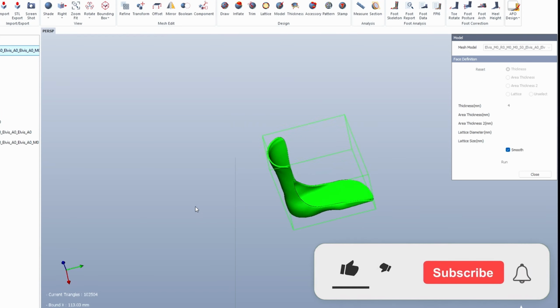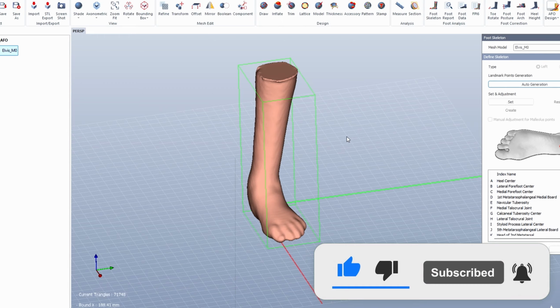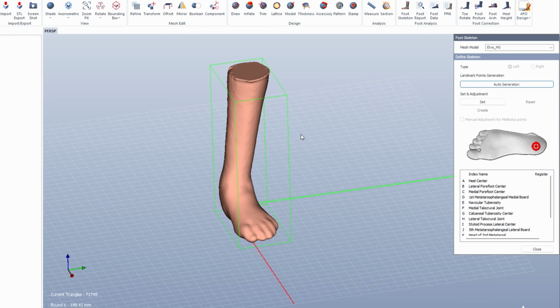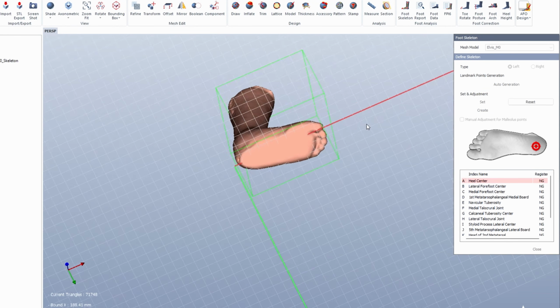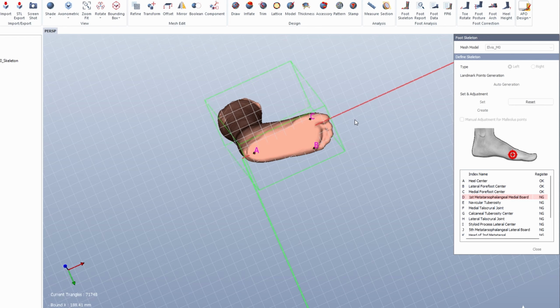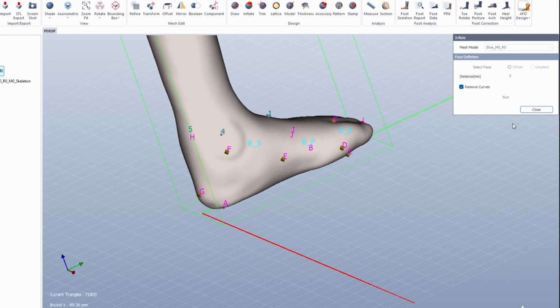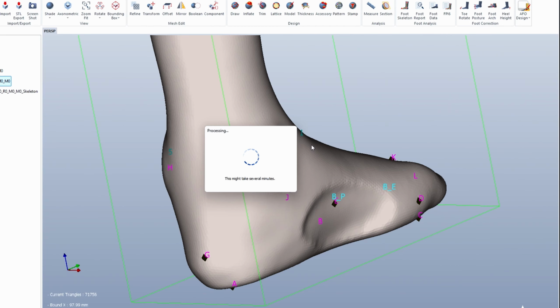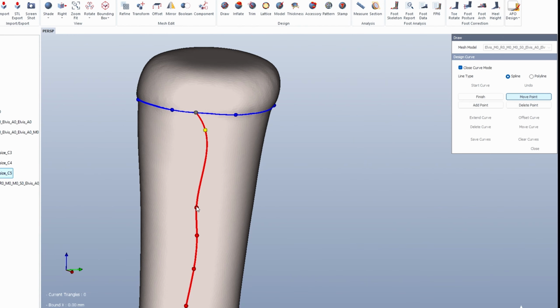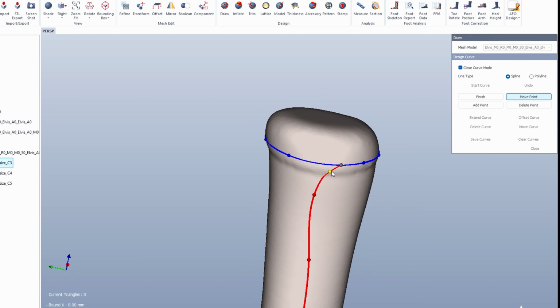This detailed walkthrough showcases the full process of designing an ankle-foot orthosis, AFO, using a patient-specific digital scan. Geared toward orthotists, orthopedic engineers, and clinicians, the video simplifies each critical step, from importing and preparing the scan, applying corrective mechanisms, designing anatomical reliefs, forming the foot arch, and defining trim lines, to creating the final flare for optimal fit and function. The techniques demonstrated are broadly applicable across multiple platforms.